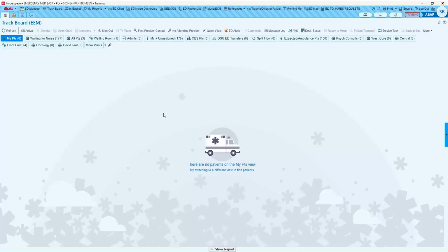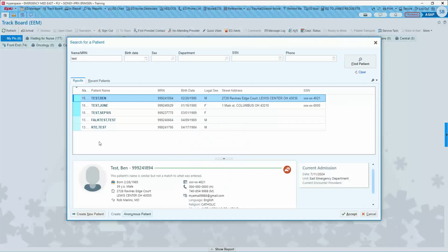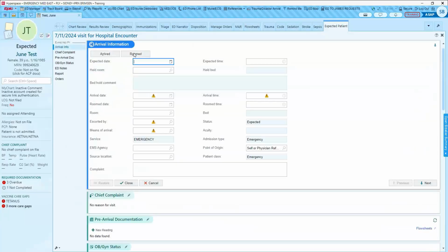Hello, today we'll be going over the Code Narrator, and to get started we're going to arrive a patient. Okay, we'll just enter a little bit of information here. Let's say unresponsive.